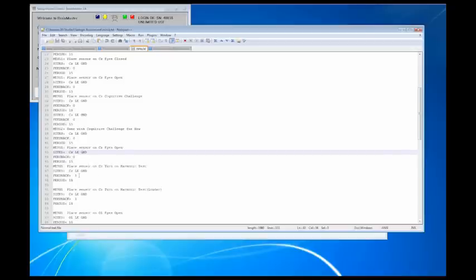Feedback 1. Okay, so now this is where I'm going to get in a little bit more detail on what feedback is and some of the ways you're going to use it. I'm going to show you a very easy way, which is in this protocol right here, and I'm going to show you a very, very advanced way, which is going to be in the next MQT file. So, feedback gets turned on in this. Now, what does that mean? Well, what that means is really difficult for me to just explain.